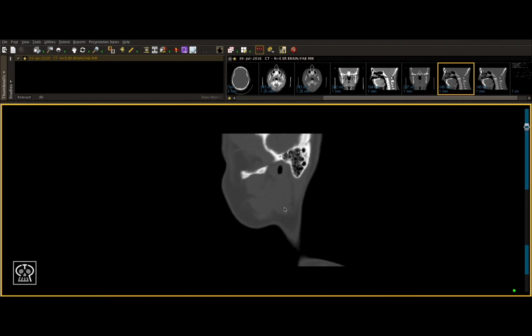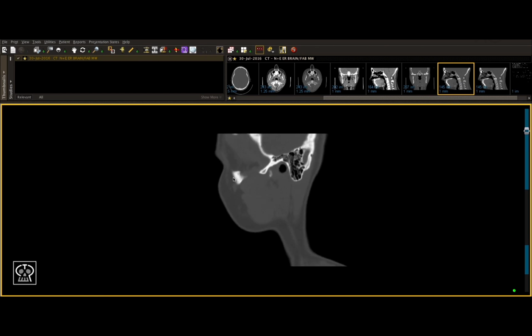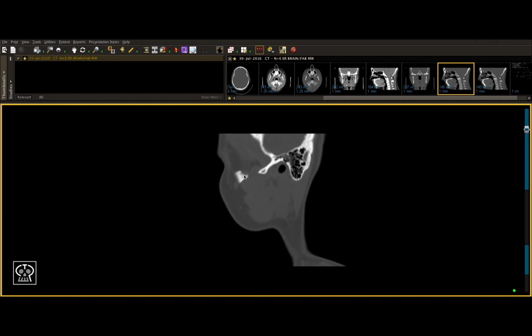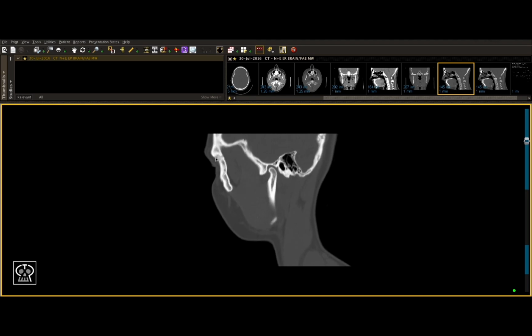Finally, in our sagittal view, you'll be able to appreciate a lot of these suture lines in more detail. Here we have our zygomaticotemporal suture, ZT suture, between the zygoma and the temporal bone. And as you can tell in this view, you'd be able to see an arch fracture quite clearly. However, the axial view is usually the easiest. Then we have our zygomaticofrontal suture, ZF.